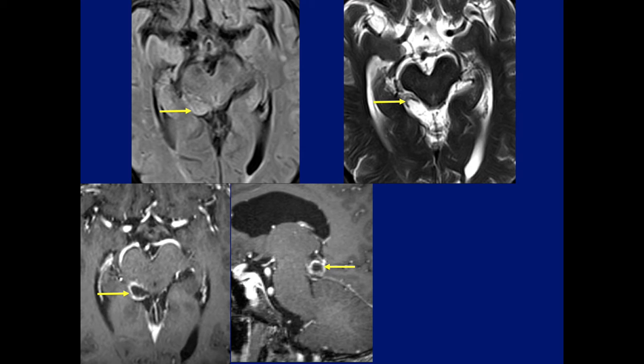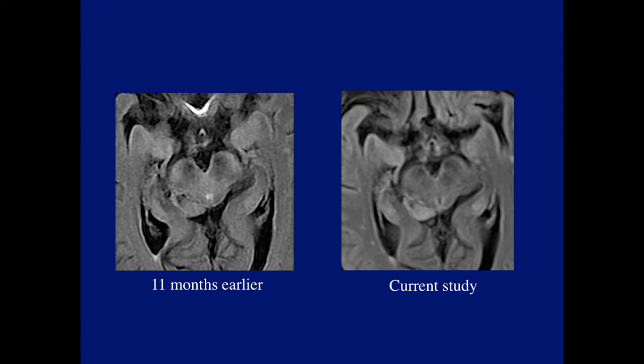As Asif said correctly, it's likely a cystic schwannoma, which has this kind of typical appearance with the rim enhancement. At the time when the study was read, a broad differential was made, infection, some sort of malignant tumor, but eventually an outside study was put on the system, and we can see that 11 months earlier, the lesion looked exactly the same.